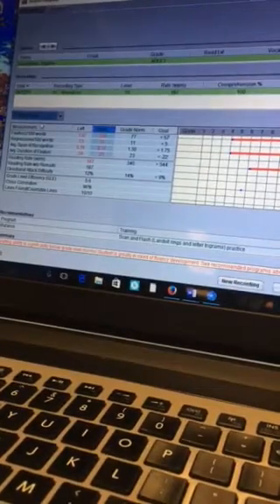So it's taking him longer to get through the passage, and some of that is going to be because when he pauses, those pauses are a little bit longer than what they should be. So I know you mentioned that your son is okay with reading. He doesn't love it. It's not something that he's going to choose to do on his own. For him, it's just going to take him a little more energy and effort to get through the passage because his brain is having to work a little bit harder, so we're going to see a higher level of fatigue with that. The last thing that we're going to look at is a graph.